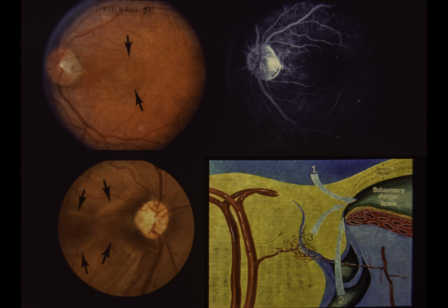Slide 51. Optic pit with serous retinal detachment. This 30-year-old female noted blurred vision in her left eye for 1 month. The right eye was normal. The left eye had 20/40 visual acuity and a cecocentral scotoma. Upper left. A grayish optic pit is seen temporally in the left disc. A sensory retinal detachment extends temporally from the disc and includes the macula. Yellow precipitates are present on the posterior surface of the detached sensory retina.